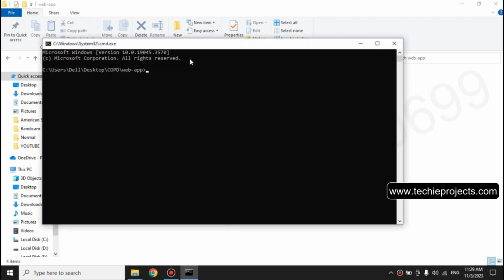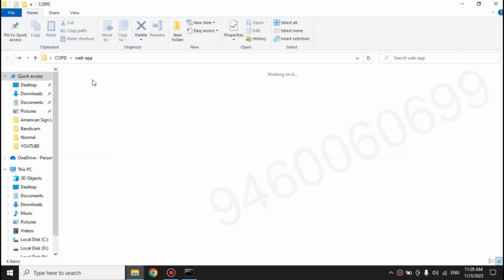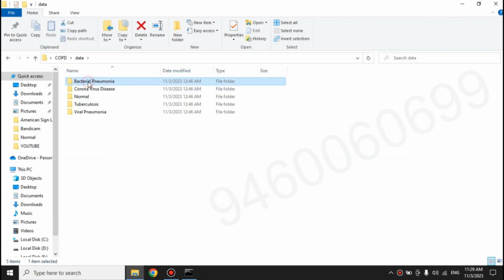So in this video I will show you the COPD, or chronic obstructive pulmonary disease, detection project. In that project we are detecting multiple diseases using machine learning and the Python programming language.